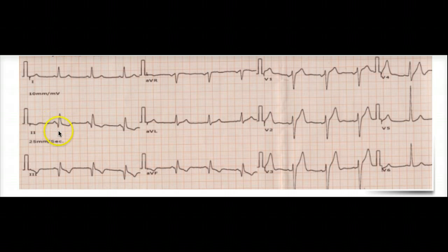The big Q wave kind of starts from lead 2, so we can see a significant drop here, right? Because this is an ECG where the pictures are kind of small and Q waves are really small. So we start seeing it from lead 2, but it becomes really big in lead 3 and AVF. It's quite big and prominent in this ECG.